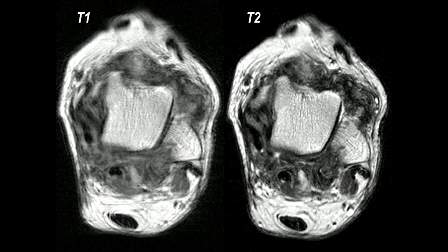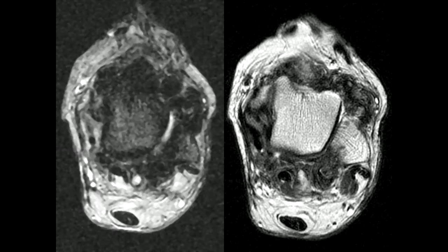This is a patient who came in with a mass-like area around the ankle. You can see on even conventional T2 weighted images without fat suppression, the loss of signal on T2 weighted sequences indicative of magnetic susceptibility from the hemosiderin, nicely shown. And of course, on gradient imaging, there was really extensive blooming, again confirming the presence of hemosiderin in this patient with pigmented villonodular synovitis, now which would be, of course, diffuse intra-articular tenosynovial giant cell tumor. And again, the gradient echo sequence.